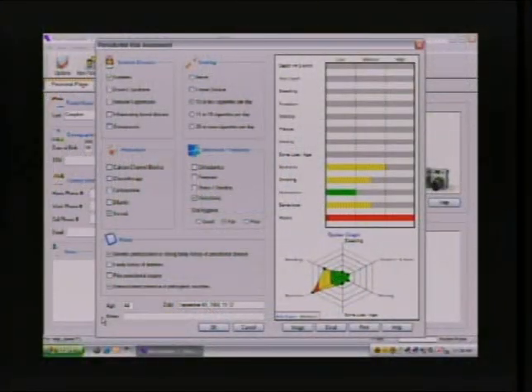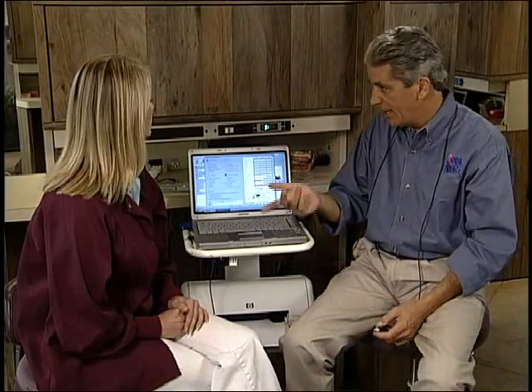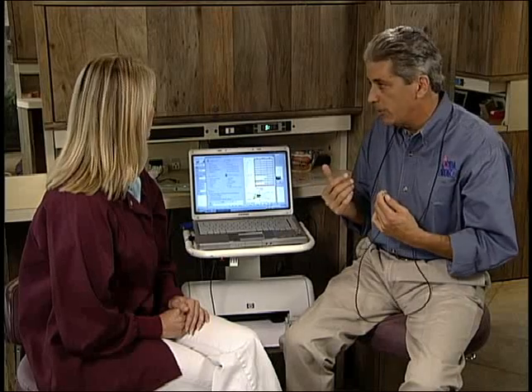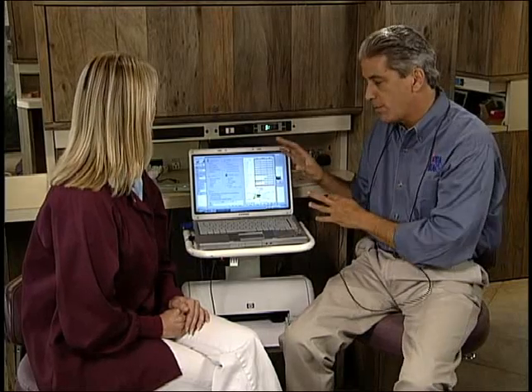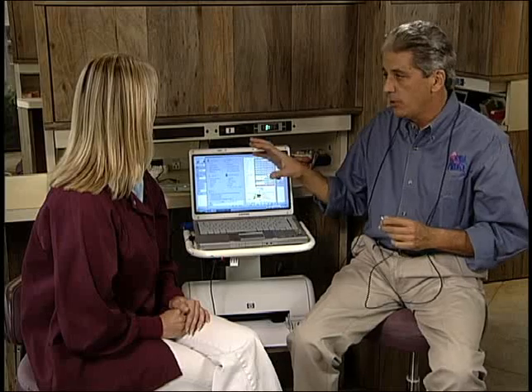The bottom part of this graph, we've just collected by the query. The top will be filled out by the exam, the actual probing, and we'll come back to this and look at what value this has for us. Any questions about the risk assessment? No. The real value here is in the query.